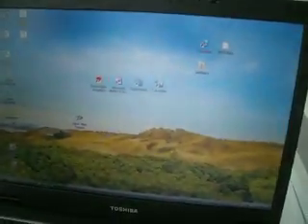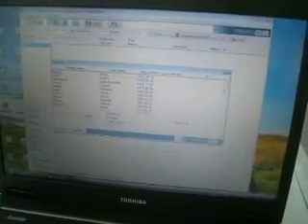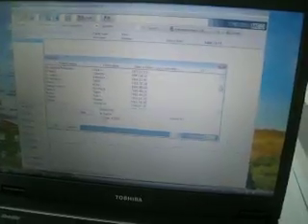Let's go back to the software. I will close the print preview now and go into some more functions. If you would like to search in the database, please click Open. There you can see all the patients recorded under the specific user.